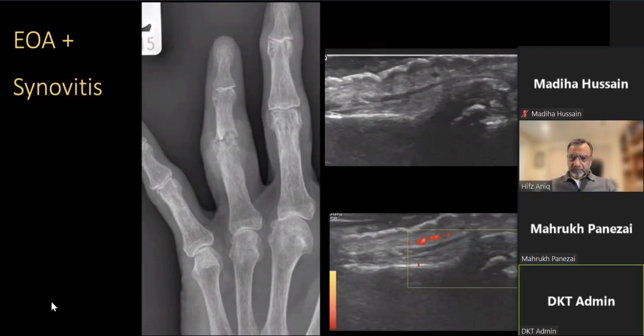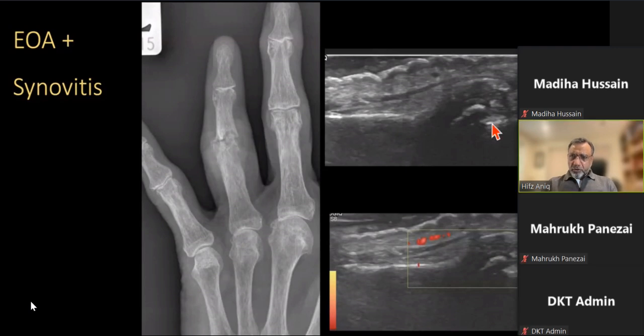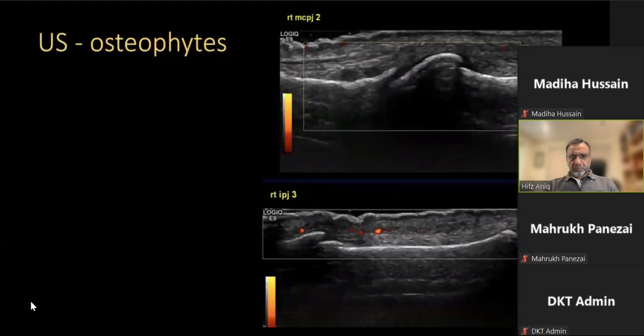Can you just explain osteophytes on this ultrasound image? Can you just point it out? Yeah, sure. Let me go back to the previous ultrasound because that will make your life easy. Okay. Yeah. So you can see the osteophytes? The bone outline should be very sharp like that. Okay, but something which is projecting out is an osteophyte. So this is something projecting, but again, sorry, it is continuous with the cortex, but bulging outside.